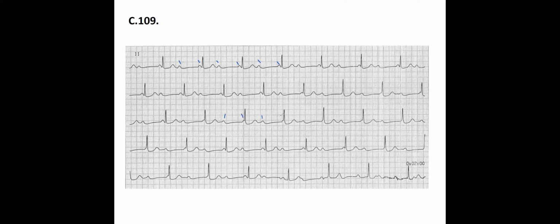See, there is no connection between the P waves and the QRS complex. So if there's no connection, this is an AV dissociation, so it means third degree AV block with a junctional escape rhythm. So it's a lower junctional escape rhythm. Okay, I see. So this is why it is a long strip, the same, lead number 2. And by looking at the P waves and the PR, you can see that the PR looks shorter, see?